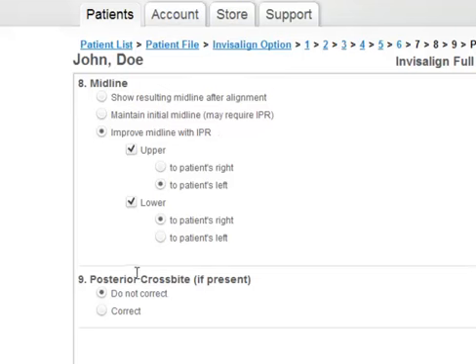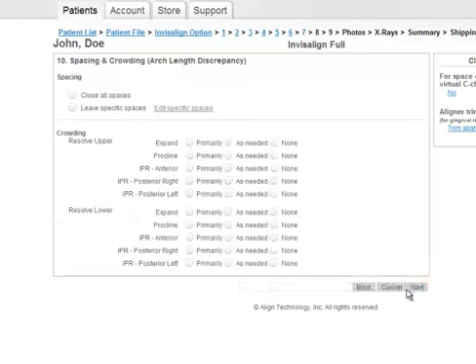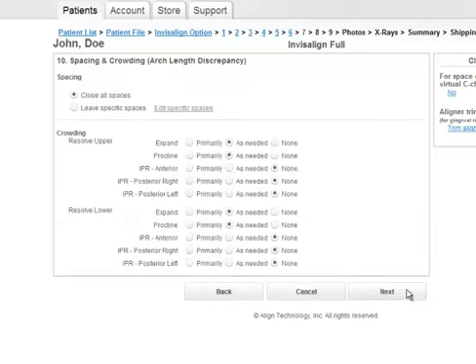The cross bites, you usually by default do not correct cross bite with Invisalign. It's hard to do, but if you really want to do it, you can ask the Invisalign to try to do it. I've done it a few times. I would say that simple cross bites are easy to do, but skeletal cross bite you should not correct with Invisalign. It just doesn't work.